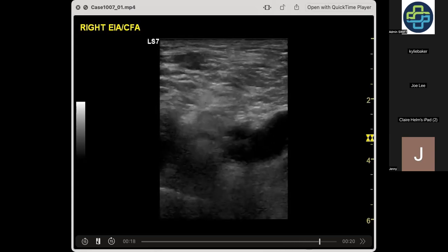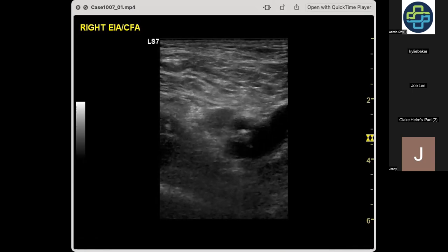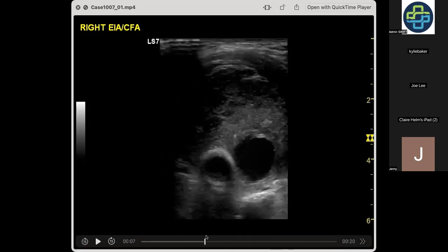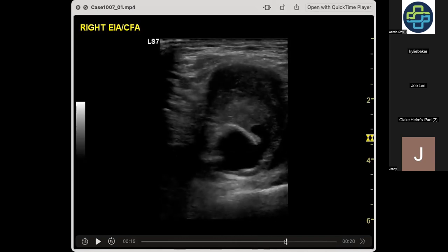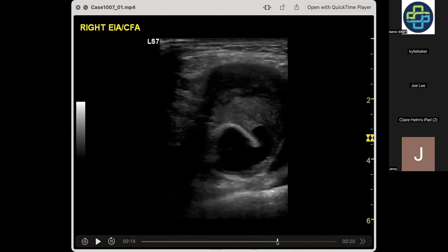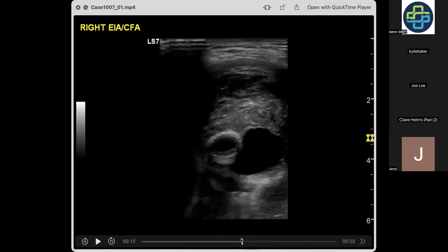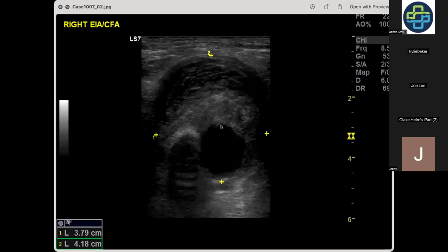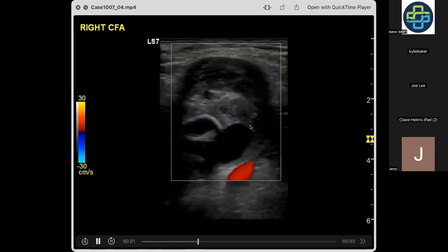I'm not sure we can actually say, but I think what we can say is that at the distal end of the stent, there's a pulsatile area surrounded with a lot of thrombus, suggestive of a leakage where the stent is meant to join. So let's see what other pictures I've got of this.